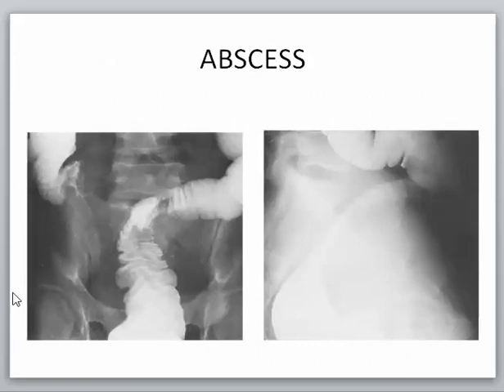Here the pelvis can also show some changes due to abscess formation or masses in the pelvis. Of course here there is no invasion or no infiltration, it's only submucosal edema because of the homogeneous thickening of the mucosa. The mucosa are thickened in a homogeneous pattern. There is no definite irregularity but only indentation, and here the rectosigmoid is indented. This is something benign, and it's not malignant infiltration or invasion, and it proved to be an abscess.